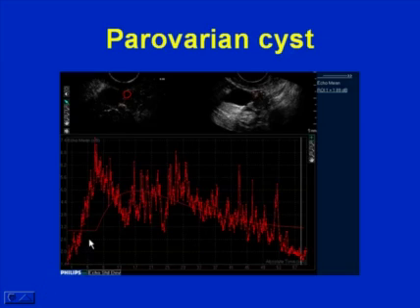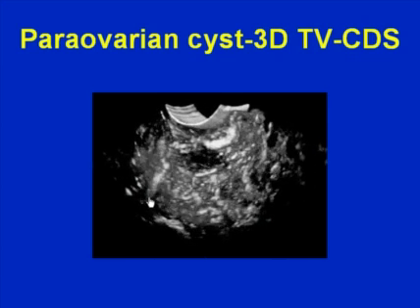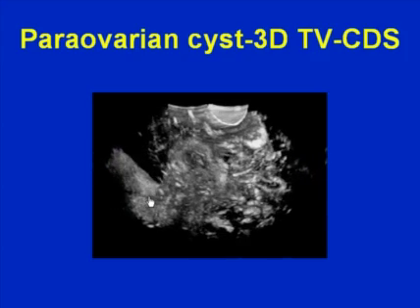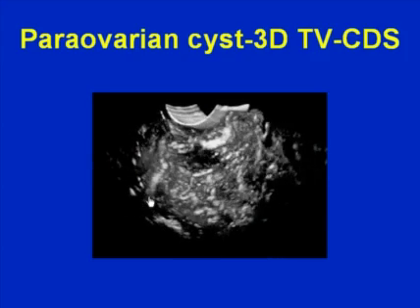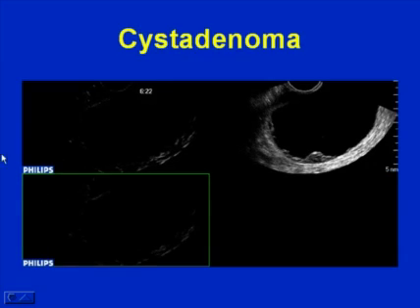Now, here's the time activity curve when we look at this area of interest, and we can see that there's a relatively sharp upstroke, but relatively little as far as peak intensity. And this is the 3D of this lesion showing the vessels and their distribution. Now contrast this to this lesion.